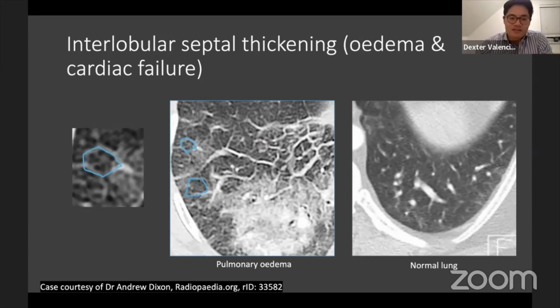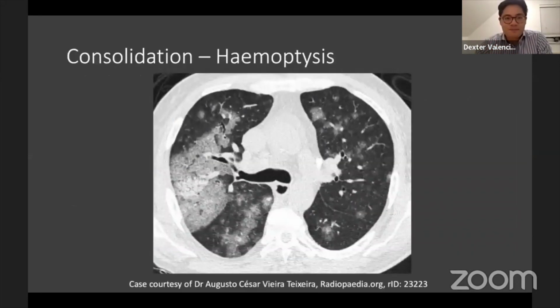And those are those veins that have been distended because of cardiac failure. The heart's not pumping it, so it's all just backlogged in these veins. And that's what's happening. You're getting these secondary pulmonary lobules being filled, and that's why you get all these lines and Kerley B lines. Contrast that to normal lung. So that's an explanation as to why you get Kerley B lines. That's what's happening at a microscopic level. You're getting these veins distended.